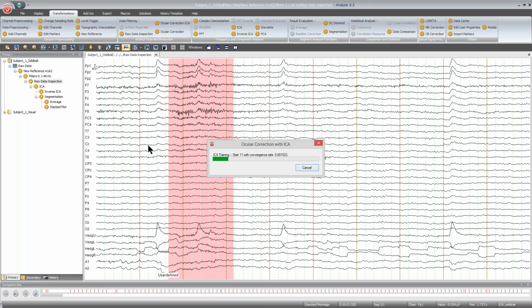It's actually a rather small data set, but in this case my computer might just be a little slow and need some more time to compute it. But I'm sure it will be computed in a second. And here we go.